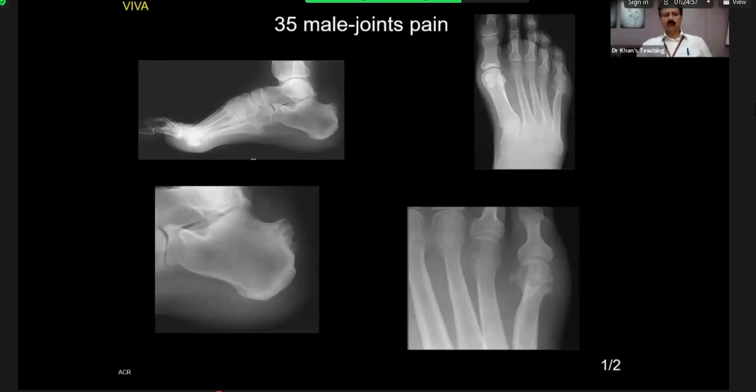And what is your differential? I think seronegative arthritides are possible. Okay. What about RA, as in rheumatoid arthritis? It's a relatively unusual patient for RA. I suppose I should mention that the bone density is preserved. Okay, apart from obviously the eroded parts. Okay, excellent.